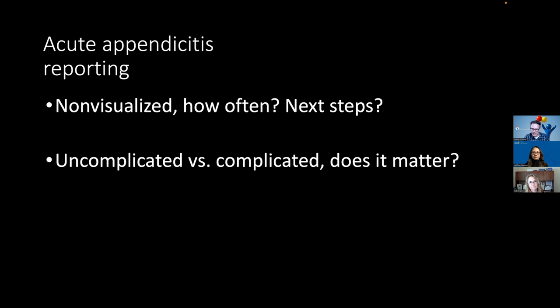But that was one other thing I wanted to ask you guys too. In that first case you showed, Hai-Tui, with the slightly bulbous look of the appendiceal tip, I feel like if we see the appendix on ultrasound, I'm a little bit biased, but in those scenarios where we see the appendix really well, I'm not sure that CT and MRI really adds a whole lot. The resolution of the appendix is oftentimes worse on those modalities compared to ultrasound.